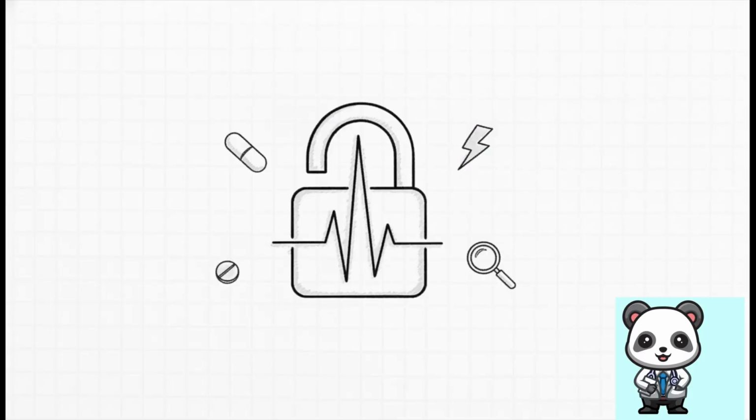Mastering this single wave is a total game changer. By systematically understanding the dominant R wave in V1 and AVR, you transform from just looking at random squiggles on a page to confidently diagnosing structural overloads, electrical miswires, and massive toxicological emergencies. We've gone from normal baseline anatomy right through to RVH, RBBB, posterior MI, and sodium channel blocker toxicity, all just by focusing on the behavior of a single wave in two specific leads.